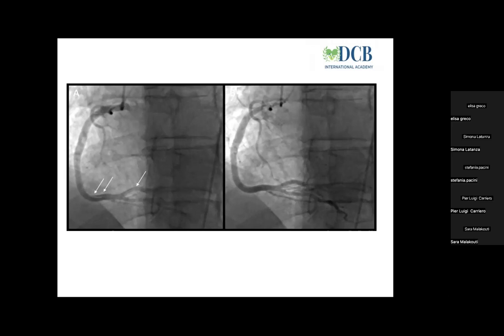It's difficult to say. We have to see it in movement, so it would be easier to diagnose. But it looks like a SCAD type 1 in the distal segment. Yeah, but on top of this, Vakas also pointed out the possible thrombus in the mid part of the RCA in the first image, that white part that can be associated with spontaneous coronary dissection.